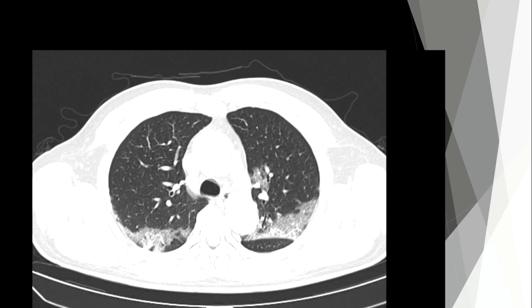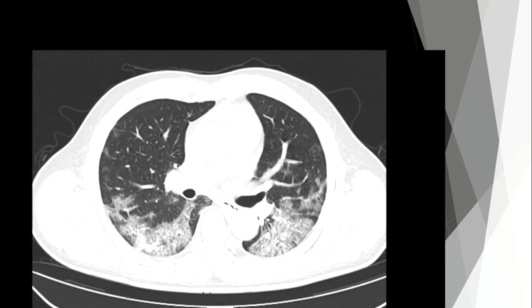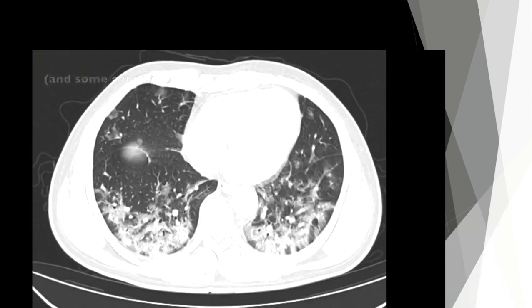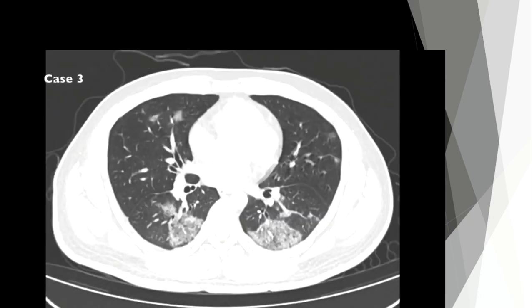Also notice in this case that there are bilateral infiltrates with crazy paving that's predominantly peripheral and posterior, and there are a number of other locations with more rounded involvement as well. The observation was made by some radiologists that we're often seeing this pattern, called the reverse halo appearance, or the atoll sign, in patients with COVID-19.